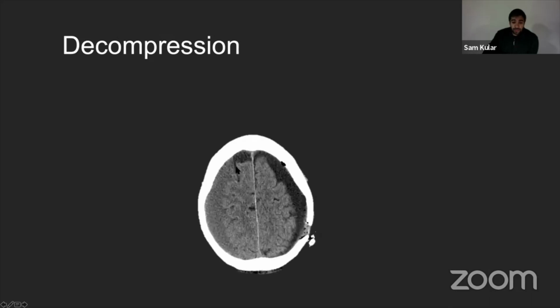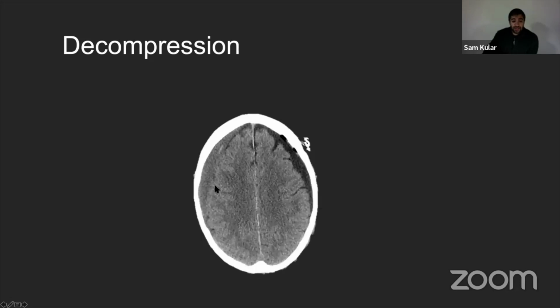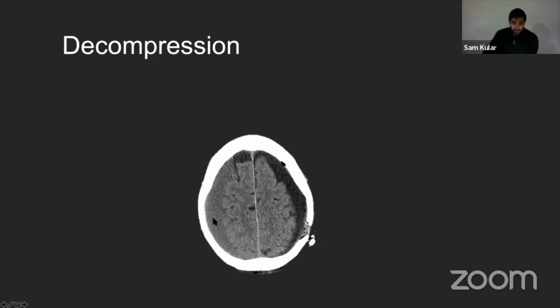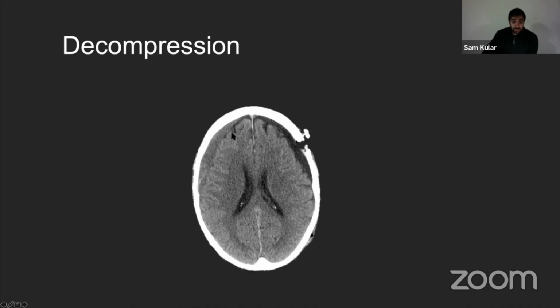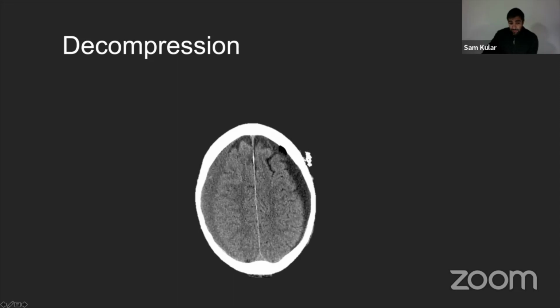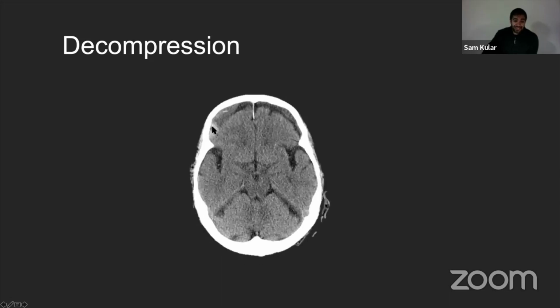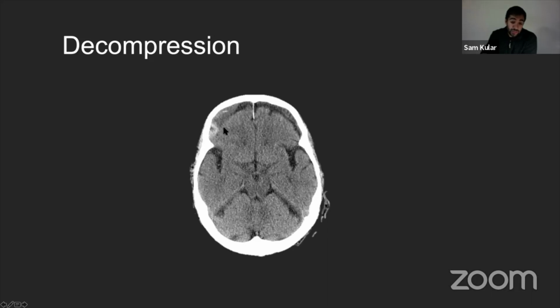And then immediately we can see on the right, there's this rather isodense, predominantly right-sided collection or hematoma that again, crescent shaped, does not cross the midline, but it does cross the coronal and lambdoid sutures. But there's also the lower down aspect, there's some higher density here. So we can see there's an acute on chronic subdural hematoma, or an acute on subacute hematoma.